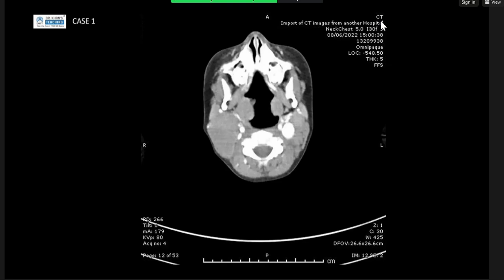I need to see the full series of the images, and I don't see another same lesion on the other side. It is more common to come, 60% or I think 30% bilateral. I need to see also the coronal view to exclude other paraganglioma. This is a highly vascular tumor. Could be done with a CT scan. It is paraganglioma, and also this doesn't need a biopsy. I'll convey my findings to the referring physician and refer the case to the head and neck surgeon.